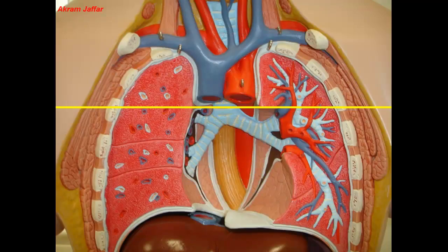Now, this section is almost at the level of the transverse thoracic plane, that is to say, the level of the lower border of T4 vertebra. It is also at the level of the manubriosternal joint, the sternal angle. There are many relations taking place at this plane, but of course we cannot see all these relations in only one section. What we are going to see right now is a section that passes at the level of the arch of the azygos vein. This is the azygos vein coming from behind forwards on the right side, and it will meet the superior vena cava.